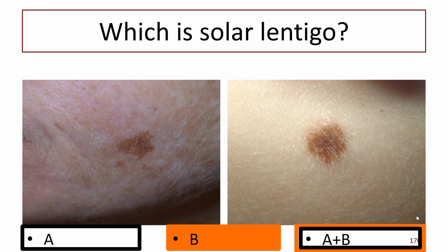Moth-eaten shape. Which of these do you think is a lentigo rather than a nevus? One here is a lentigo, the other is a nevus. Great. So to remind you that the lentigo is an acquired sun damage spot. It's actually keratinocytic, so you've got proliferation of keratinocytes, often pigmented because those keratinocytes gather up pigment, whereas the nevus is made up of melanocytes or nevus cells.